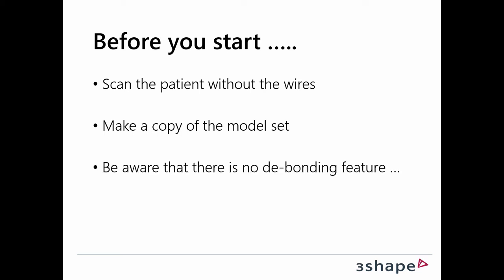And thirdly, be aware there's actually no debonding feature in the Ortho system, and you may think this is strange having a video about a feature that doesn't exist, but actually we're using an existing feature in the Ortho system for doing debonding, and Rikke will show you just in a minute how that works.